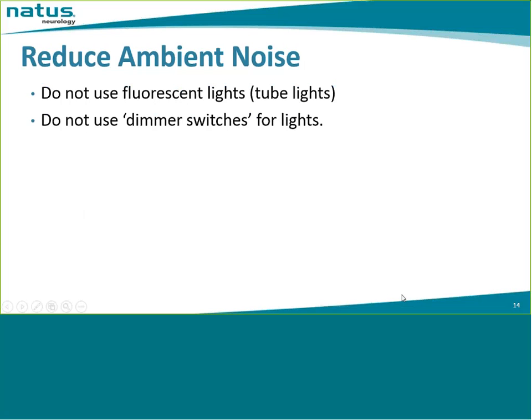They also give out a lot of electromagnetic radiation. This kind of noise or interference is usually seen as thin spikes in the baseline that are repeating at the power line frequency. So you will see them at 50 Hertz or 60 Hertz.